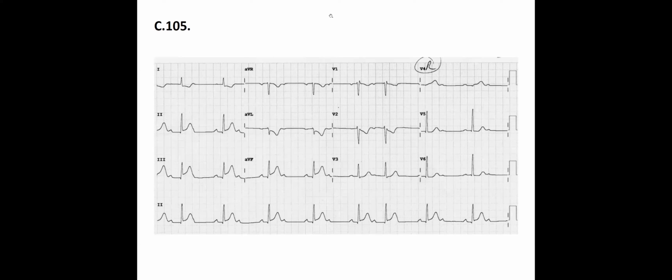Okay. Let's see. Where are the P waves? Now we should consider the PP interval. I would say that these are the PP intervals, and sometimes you do see a P wave here, for example. That's a P wave right here. If you compare, you can see immediately what the difference is, because that's not conducted.